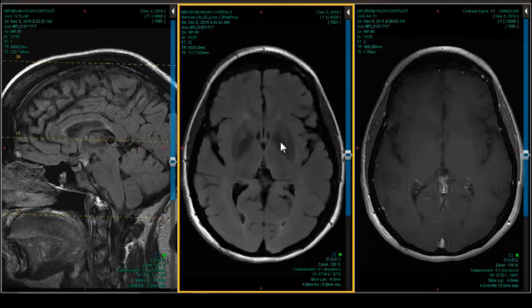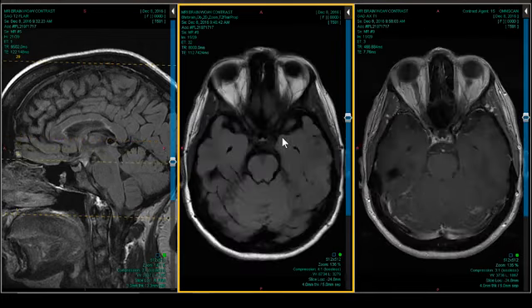You can see exaggerated brain iron in the globus pallidus in Hallervorden-Spatz disease, also called pigmentary degeneration of the globus pallidus, now known as pantothenate kinase deficiency. He doesn't have that. He's got decent iron there. You can see juicy putamen compared to our Huntington's chorea case. The putamen has a normal signal intensity on FLAIR.